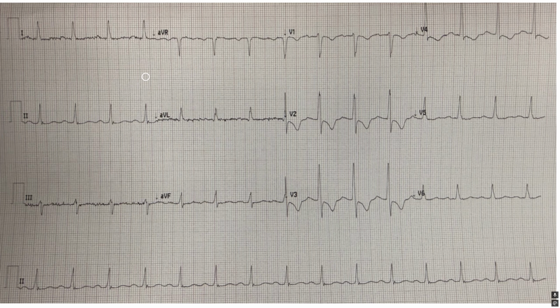Okay. Now on to lead 1. The T wave is flattish, which is non-specific, no significant J-point deviation. J-point looks okay there. T wave upright. J-point looks okay. T wave flat. J-point looks okay. T wave kind of flat. We already looked at that. AVR, I'm not seeing much J-point deviation. Inverted T wave, which is normal. Here in V1, no J-point deviation. Inverted T wave, which is normal.